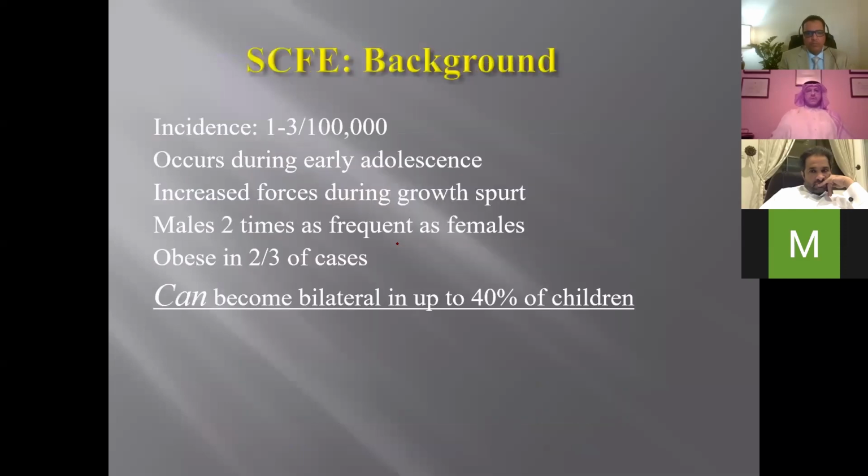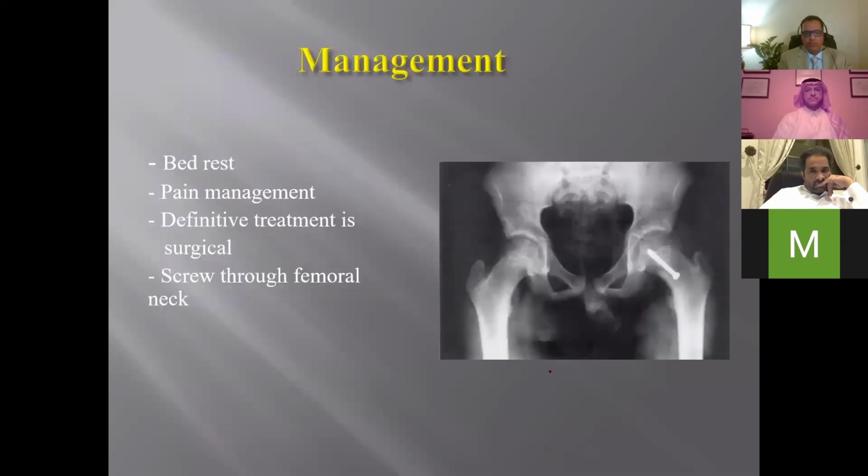Okay, so the most important thing here for SCFE is that it affects males more than females. The patients are usually obese, and in 40% it will be bilateral. The management, again, needs surgery. As you see here, this is the screw fixing the epiphyseal plate.